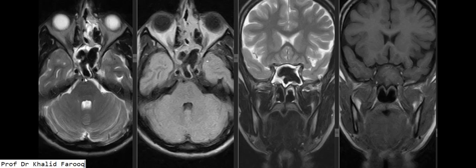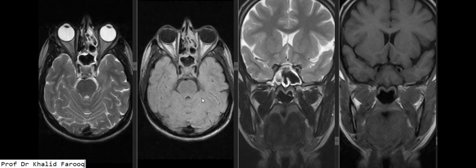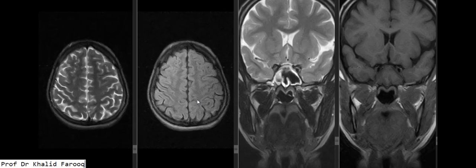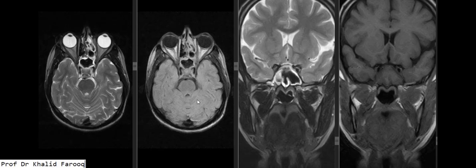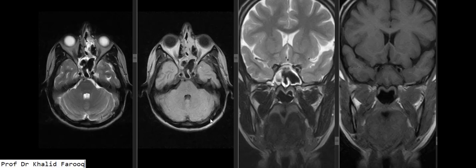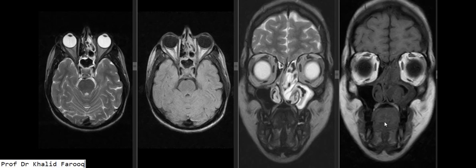And this is the area of clivus and posterior bony boundary of the sphenoid sinus where disease causes focal erosion. However, the basilar artery is patent and shows normal signal void flow in it. Overall, we can see cavernous sinus areas are normal, and there is no abnormality in brain parenchyma. Ventricular chain, brain stem, CP angles, cerebellum, and 7th, 8th nerve complexes appear unremarkable. So we have seen both CT and MR of aggressive nasosinus polyposis with superadded fungal infection.